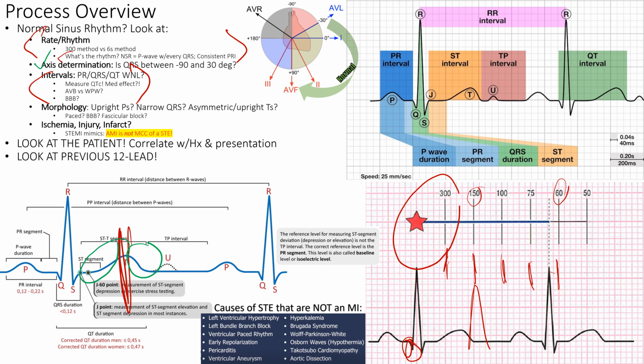Okay, and then finally, when we do our normal process, like you look at any EKG, looking at rate, rhythm, axis, intervals, morphology. Here we're looking, that's our focus today: is there ischemia or infarct occurring in front of us, right? And remember, STEMI is an ST elevation.